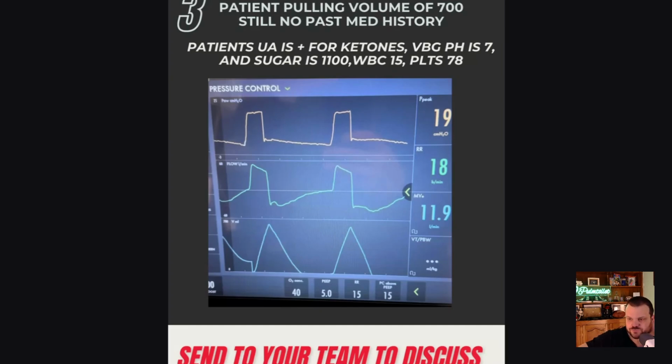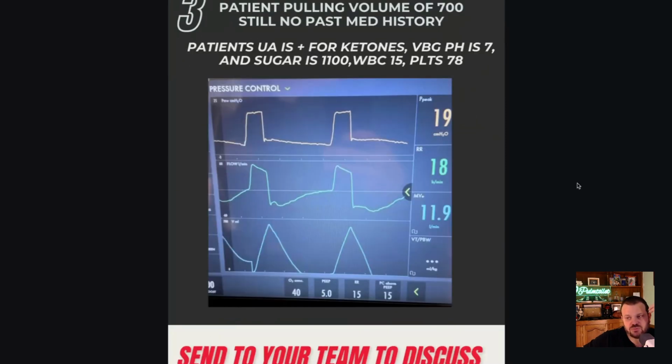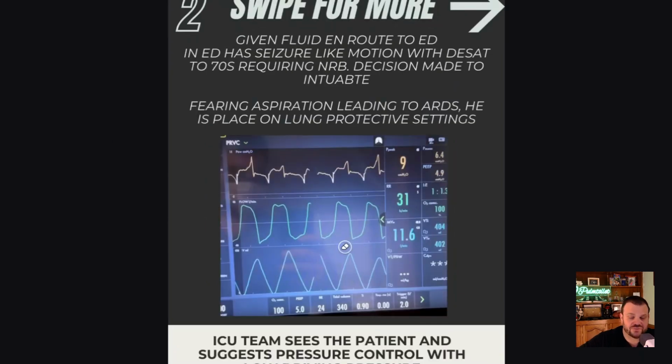So the thing that I would look out for here, or point out, is that in this situation, in the first vent screen, the MV here was 11.6, so about 12. When we gave the patient more control, when we put the patient on pressure control and made the breathing a little bit easier, let's say, because they're not breathing 31 times a minute, getting very small volumes, breathing less, getting bigger volumes, which I prefer because it takes that question of, is there a lot of auto PEEP, out of the equation? Because here, there's definitely a ton of auto PEEP.